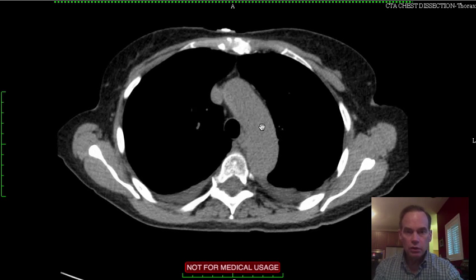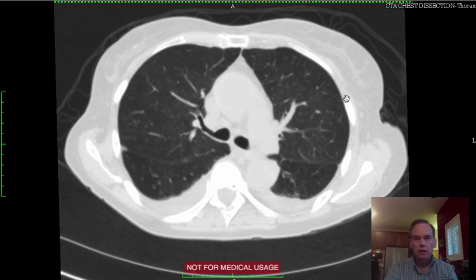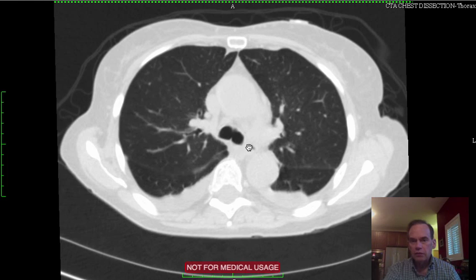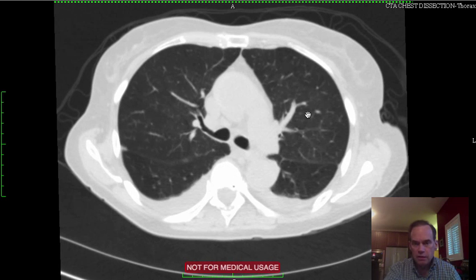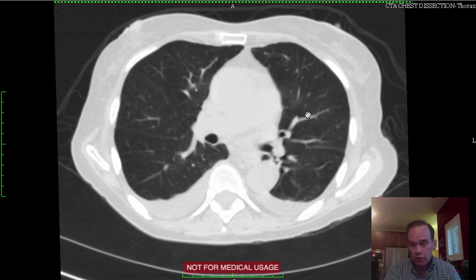Axillary regions look normal. What else do we have here? A little bit of ground glass opacities in the lungs, which could be some mild pulmonary edema resulting from the cardiac tamponade, because blood returning to the heart from the lungs is very likely encountering a higher pressure to overcome in order to return into the left atrium.